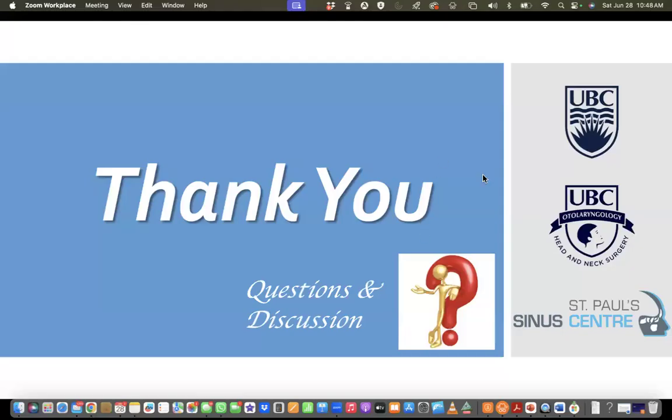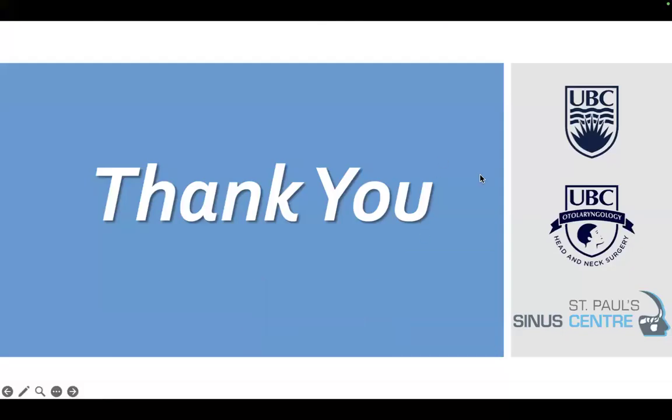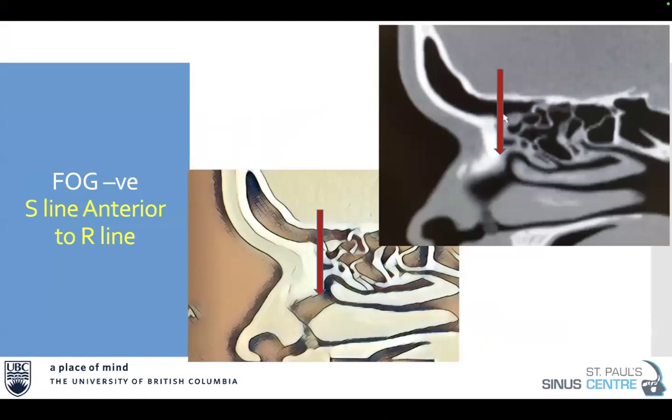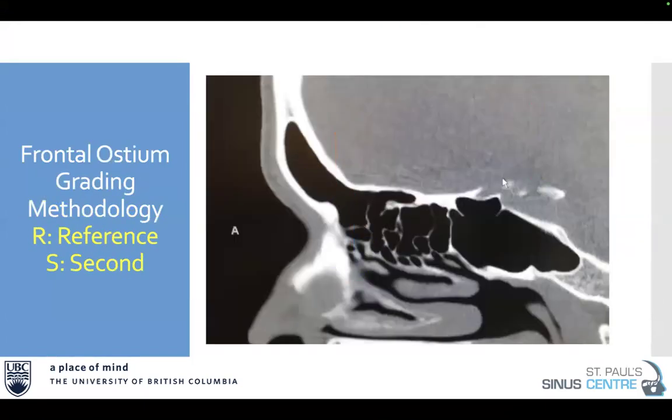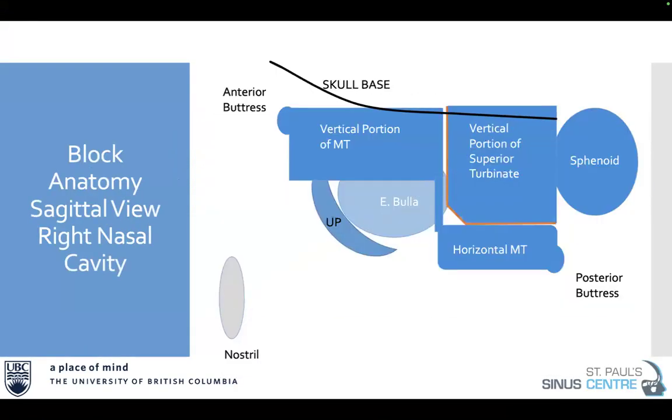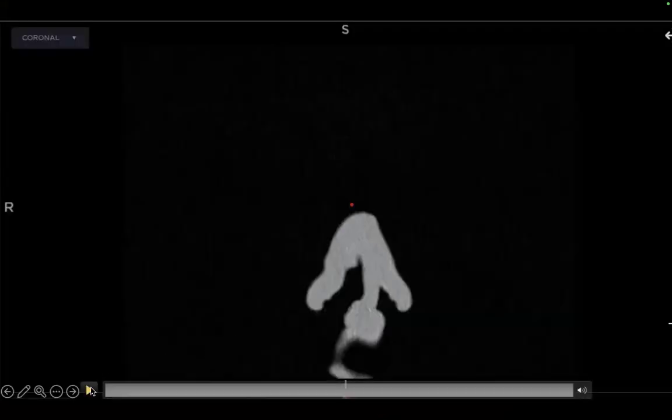Right. Okay. So Tracy asked about the CLOSE-UP system. Tracy, I like your question. I'm going to put up my slides again so we can go through the very first slide, because we can go through the CLOSE-UP system. In the CLOSE-UP system, I want you to do that every single time that you're looking at a CT scan. So here's our first scan.